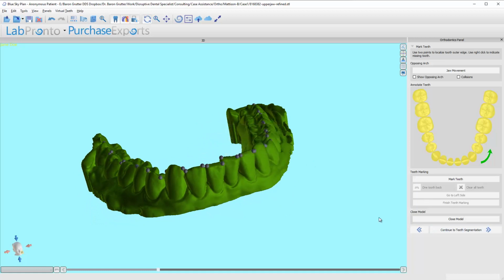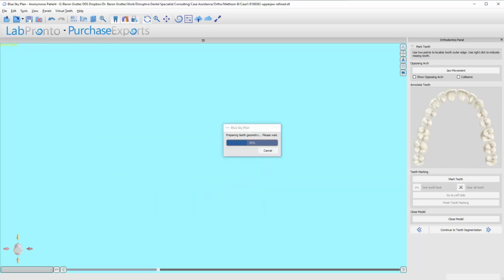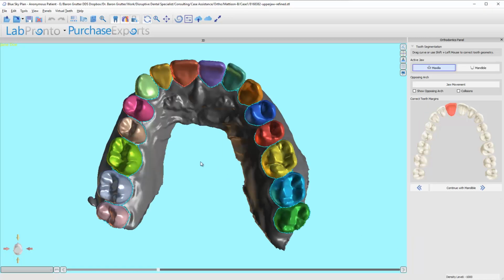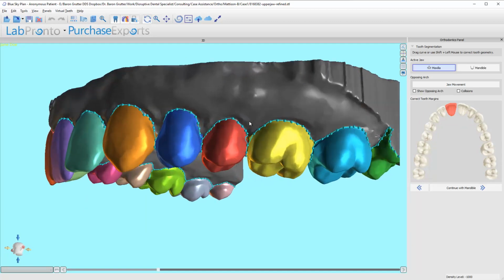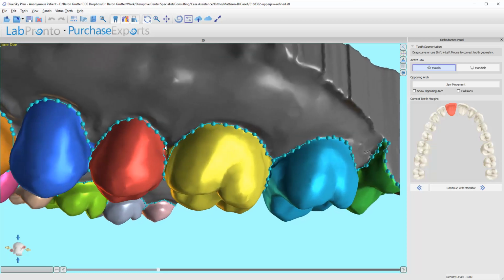This part can take a little while for the computer to process. I'm recording, and every time I'm recording, my computer runs a little bit slower just because everything is capturing. All right, it's done. And that was real time. I'm not going to fast forward this in the recording. I could, but honestly, this is a case review, and so I'll let you guys decide if you want to just fast forward while viewing.